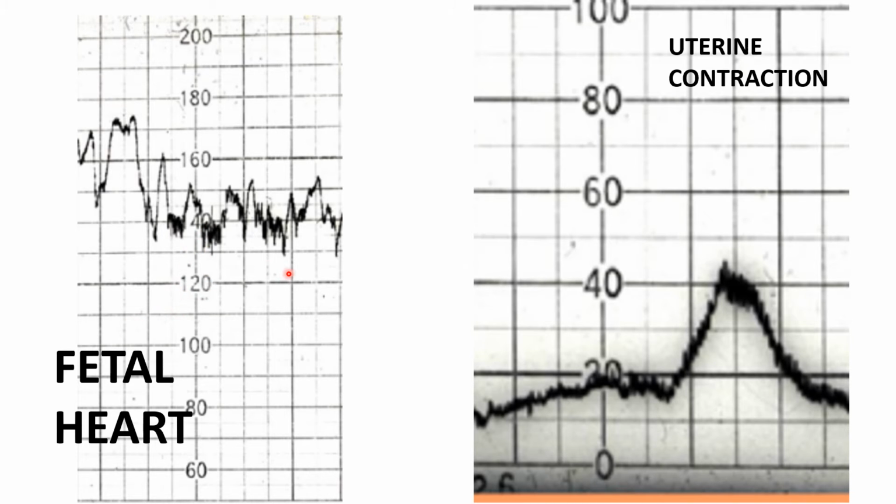It is a sign of well-being. This fetal heart rate recording is being done with the help of a Doppler and not with the electrocardiographic recording of the impulses sent by the heart. So this recording is actually a composite recording which the machine makes as it records the blips of the fetal heart. It converts them into a rate, and this rate is then printed on this piece of paper, indicating the variability of the heart rate.